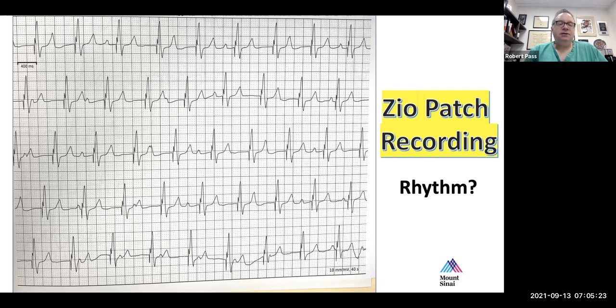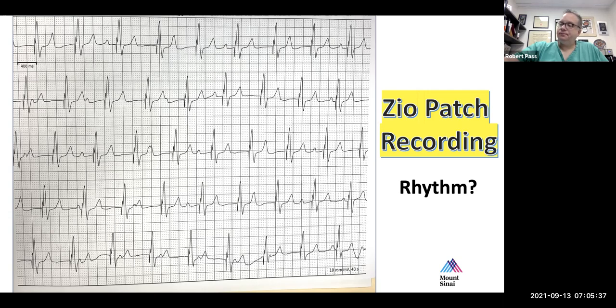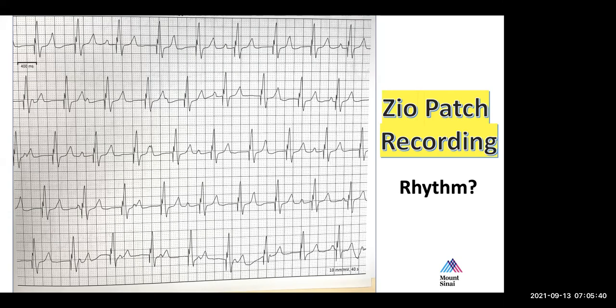Correct. So if you're in a sinus rhythm and you have WPW, there should be a QRS that follows every single P wave. Do you agree with that statement? Yes. Is that what's happening on this tracing? No, because in many, there is no P waves preceding that.